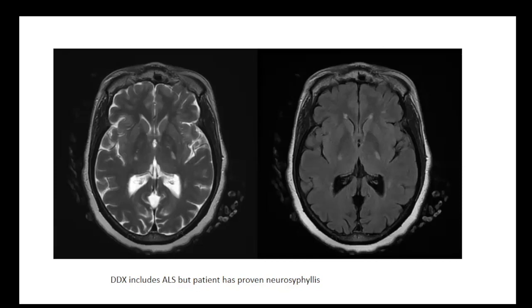So a little bit off the beaten track, but again, it should condition you to look in this area, particularly because you will get patients who are imaged for ALS. So this is one of the findings you should look for.